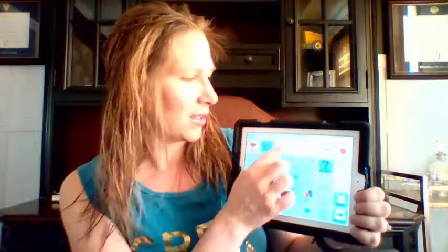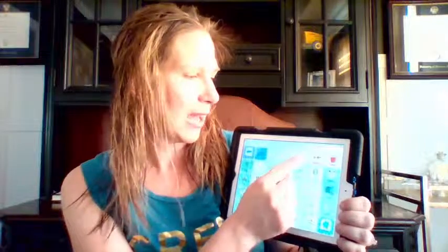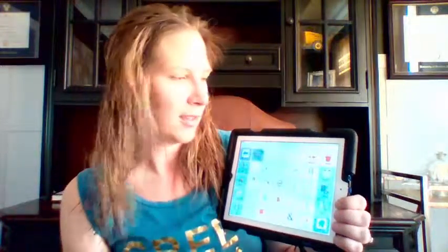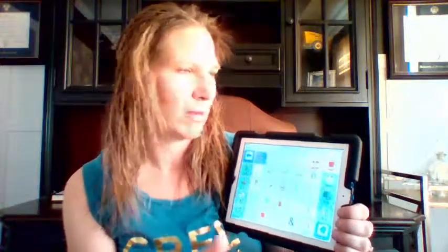So when I say this is a free app and it's not light, that's what I mean, having 4 vocab sets here. So in the Symbol Talker B, which is where I spend most of my time, you can see there's a bunch of categories here. On the top, you can see that there is a speech bar, or a phrase bar. So as you're typing in the message, you might say, "I am fast." As you're typing that message, you can then go back to the box at the top and listen to the whole message at once. "I am fast." There is an option to clear your message, which is really important for us to model for our students, to show them how to clear it.